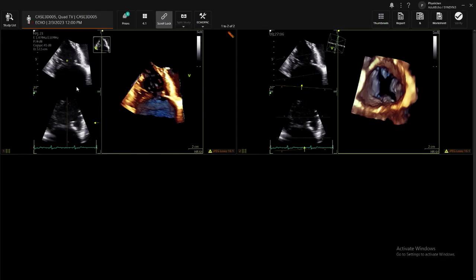And I love doing transthoracic echo for the tricuspid valve, and specifically, getting a nice 3D image of the tricuspid valve is actually often very possible. And so I think this is a place where sometimes 3D imaging is maybe underused a little bit. You can often get 3D surface echo pictures of the tricuspid valve that rival or are even better than transesophageal echo.